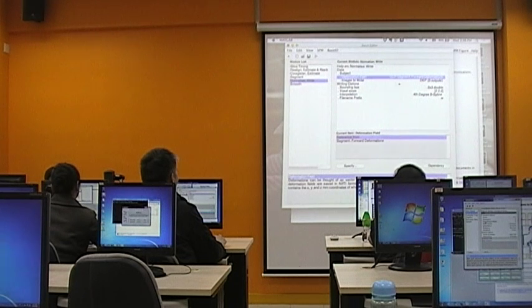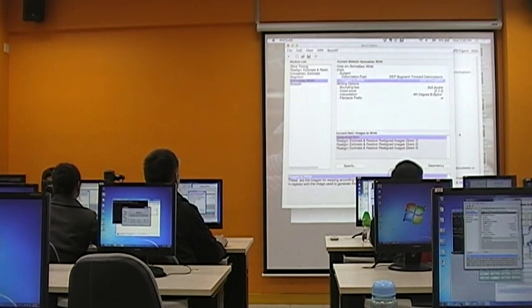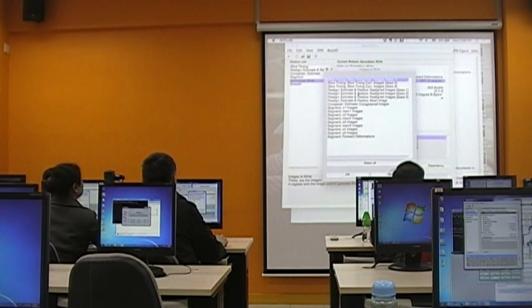So that's why you could click on dependency and then choose this file as the input for the normalization parameters. And then for images to write, if you check on the dependencies, we are going to write out the motion corrected or movement corrected images to the standard MNI space. So here you choose sections 1, 2, and 3 as the input.